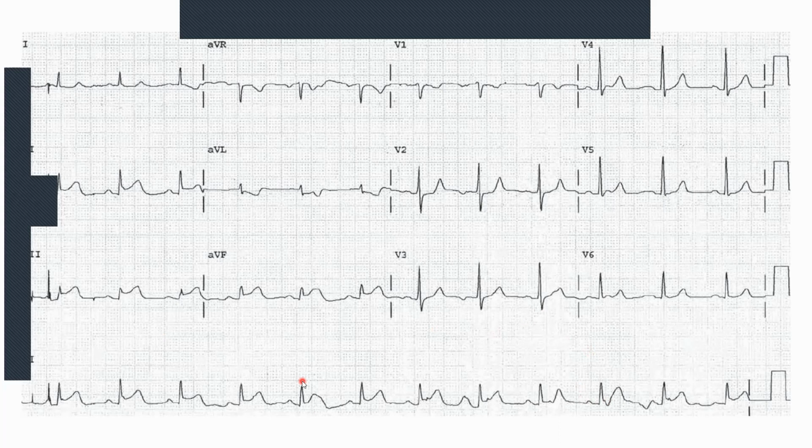So let's have a look at the zones. We can start first with the inferior zone. The inferior zone has leads 2, 3, and AVF, and we can see quite obvious ST elevations. So we can already suspect that, all right, we might have an infarct, especially if this patient is presenting with chest pain.